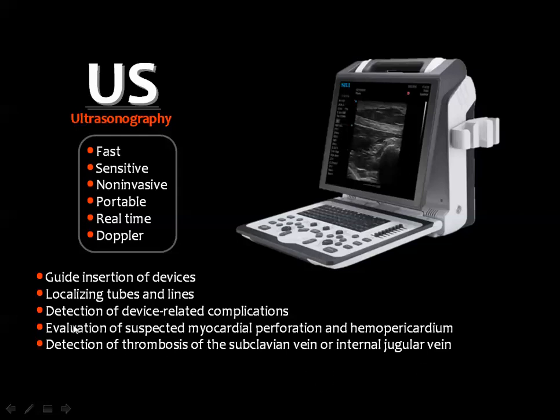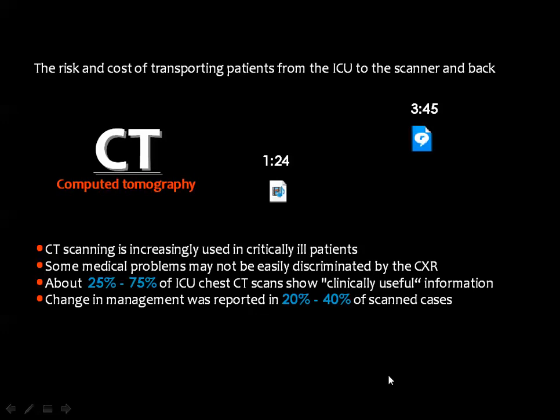Evaluation of myocardial perforation, hemopericardium, pericardial effusion can be achieved easily by echocardiography and by simple ultrasound. Detection of thrombosed vessels, especially the subclavian and the internal jugular vein.